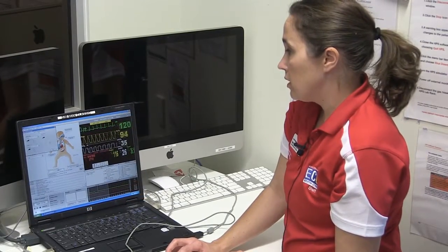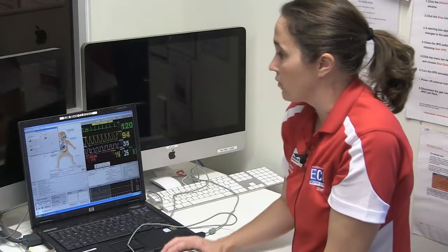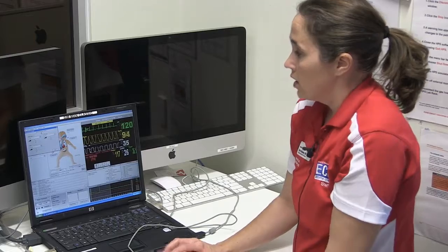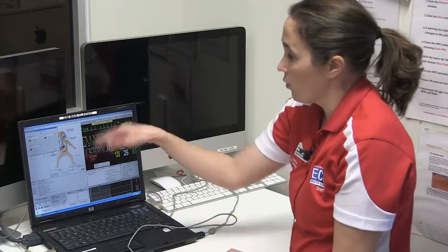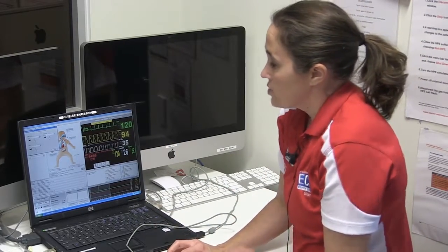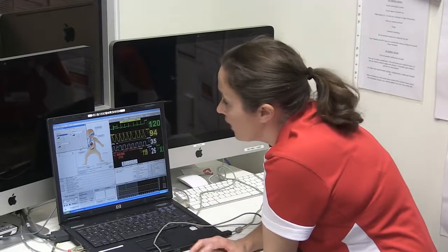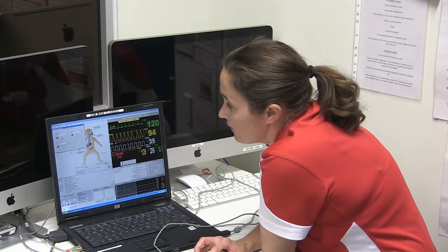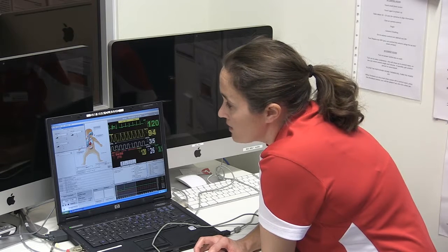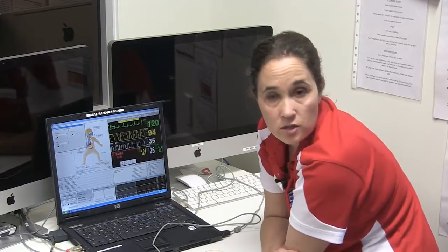Go to normal lungs. So the lungs right now are linked, and you know that because the top box says linked. So if you uncheck the linked box, you can make the left or the right lung sounds different and affect the quality of the sound as well. So for example, the right lung has rhonchi, stridor, wheezes, coarse crackles, or fine crackles that you can choose from, as well as the left. And you can basically choose that from the drop-down menu and then increase or decrease the volume as needed. If you link them up together, then they're both going to have that feature.